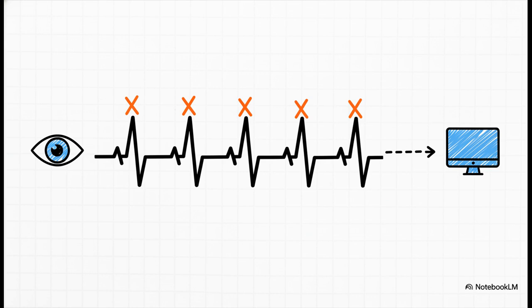And this is just brilliant. This is the visual proof. We took the results from the code and plotted them right on top of our graph. Each of those little X's marks an R wave that the computer found. It's like the computer has now seen the heartbeats. We've done it. We've successfully translated what a human sees into code that actually works.